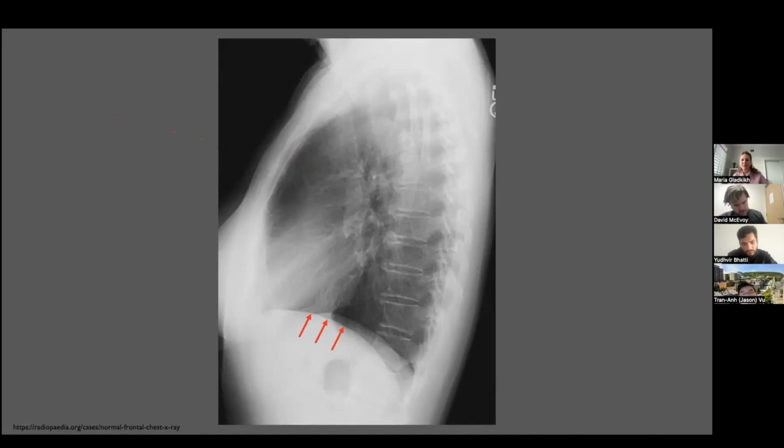Yeah, so this one is also kind of tricky if you don't know the nuances. If you look closely, there's two. Can you see my mouse, by the way? We can, yeah. Okay, awesome. So there's your diaphragms right over here, right? You have 1 and 2.